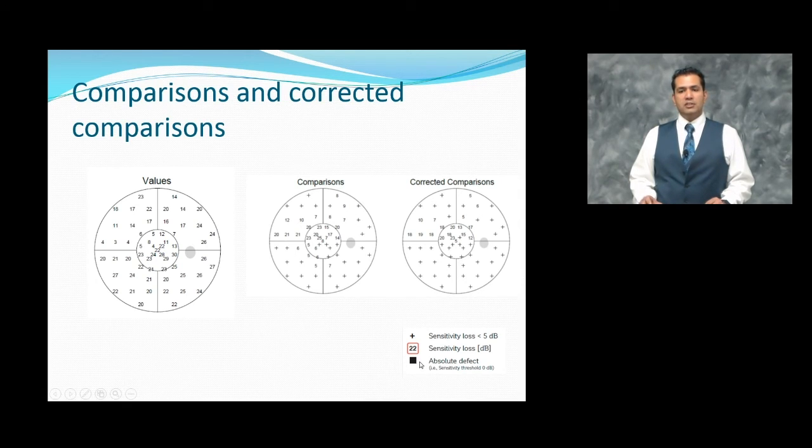If there's an absolute defect, you will see a black square represented here. From the comparisons plot, once the generalized diffuse defect, which may be due to pupil or cataract, is removed, you get the corrected comparisons plot that has the same kind of understanding. Is there a particular pattern of defect that is generated? And that's what is represented in the corrected comparisons.